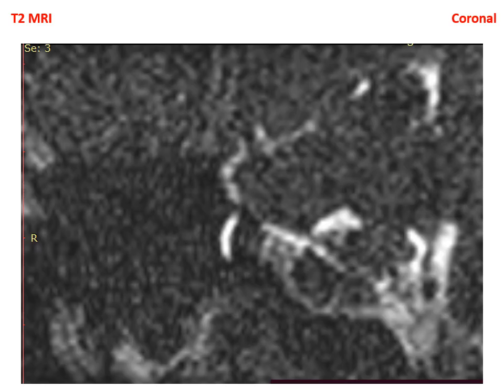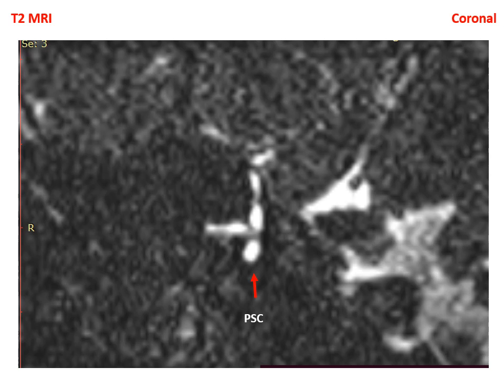We come now from posterior. We'll see the posterior semicircular canal first. This is the posterior semicircular canal, and then it will show the lateral semicircular canal. Remember, the lateral semicircular canal has two limbs, a posterior limb and an anterior limb. The anterior limb opens in the vestibule with the superior semicircular canal, and the posterior limb opens separately. We start to see first the posterior limb.